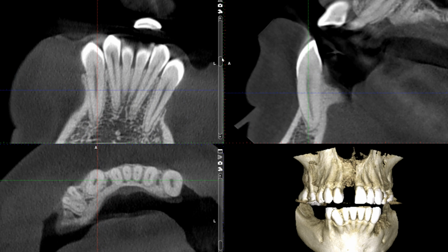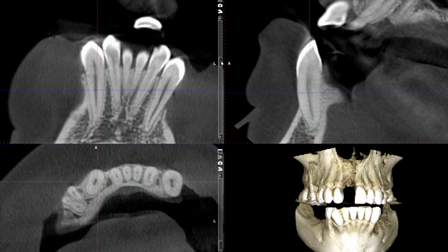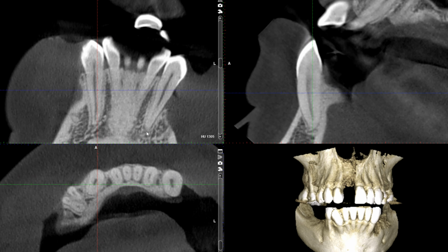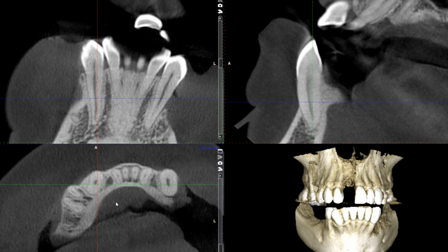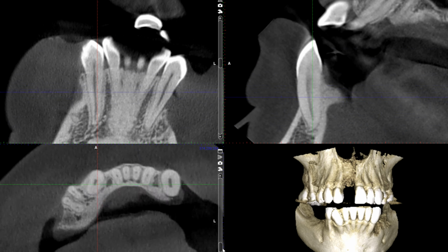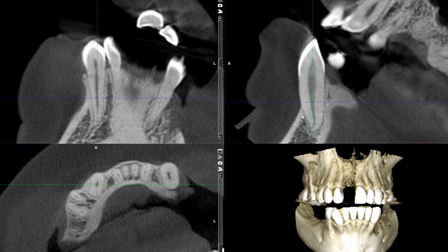On periapical radiograph, we saw that the root was nice and straight with no dilaceration of the root or the canal, and that's what we see in this corrected coronal view. Likewise, in this axial view, yes, the tooth is a little rotated, but if you pay attention to the pulpal chamber, once again, it's nice and straight. Even in this sagittal view, or corrected sagittal, you can also call this cross-sectional view, again, we see a beautiful outline of the pulpal chamber and then the canal.